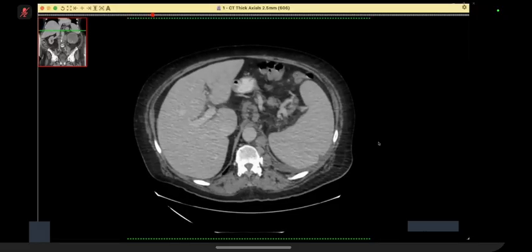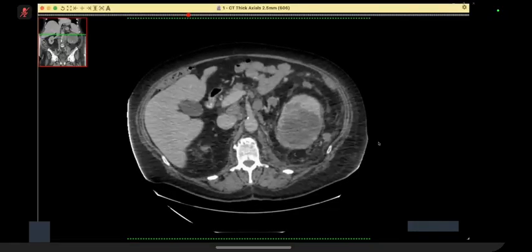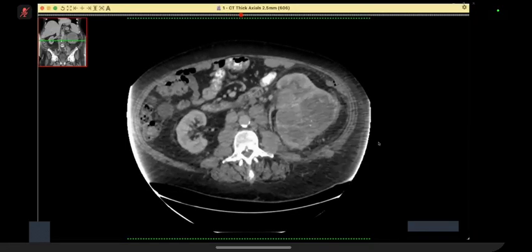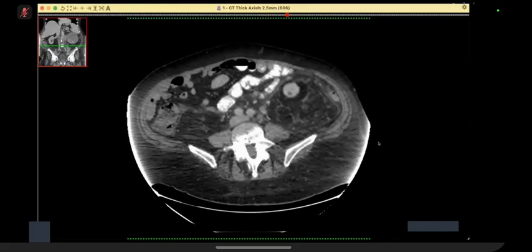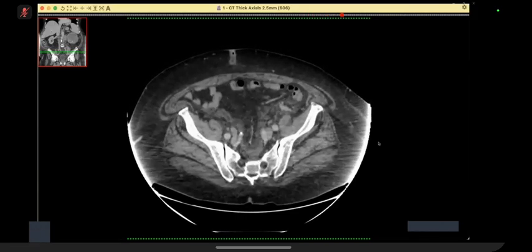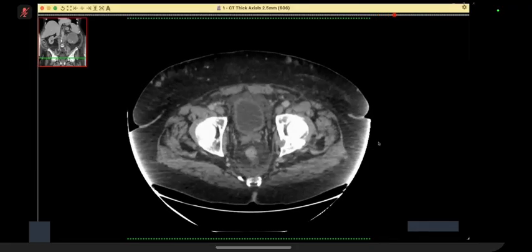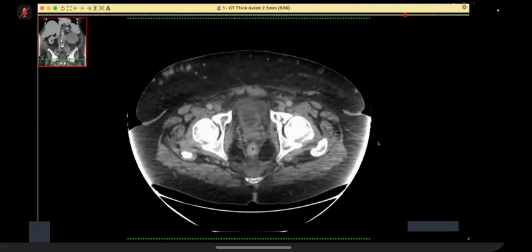In the left hypochondrium, it's the left. The left kidney is showing a marked hydronephrosis with areas of thinning out of the cortex. This is associated with surrounding congested fat planes. I want to check if there is a cause of the obstruction of the kidney.